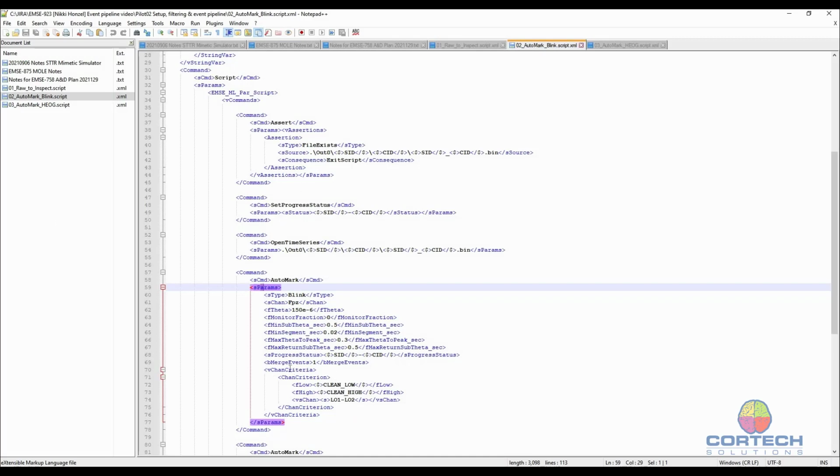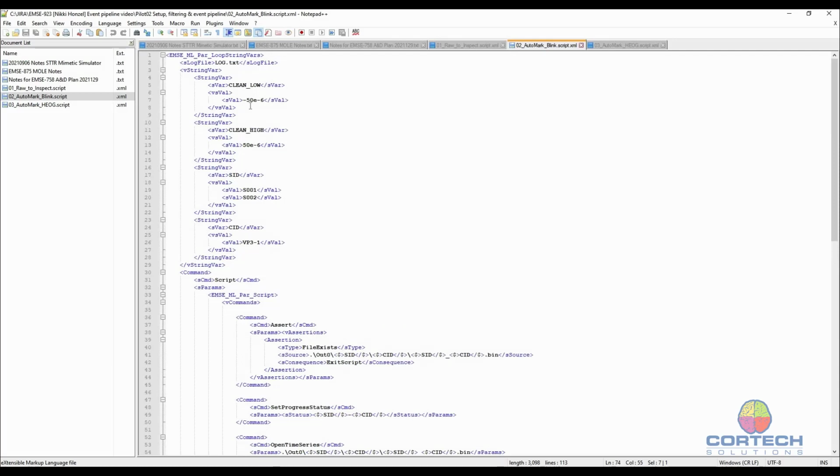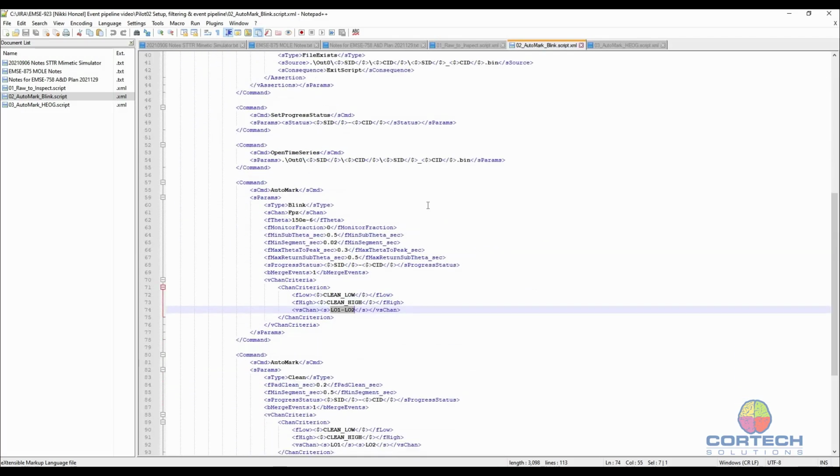And we also had some other criteria, for example, the LO1, LO2 bipolar channel that we derived has to be between 2 bounds. Between plus or minus 50 microvolts, we set it to be, in order to be considered a quote-unquote good blink.